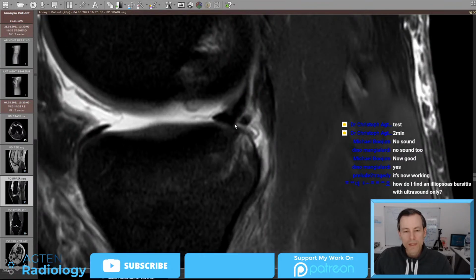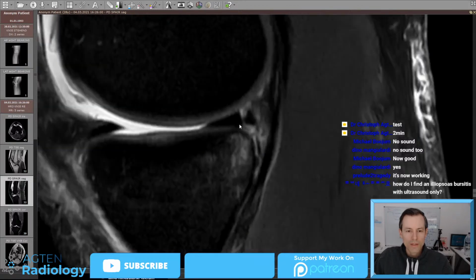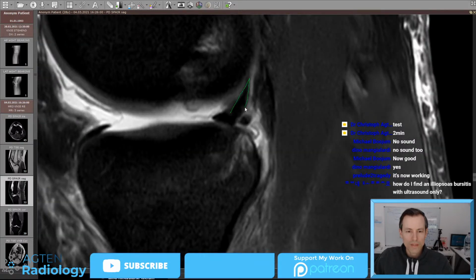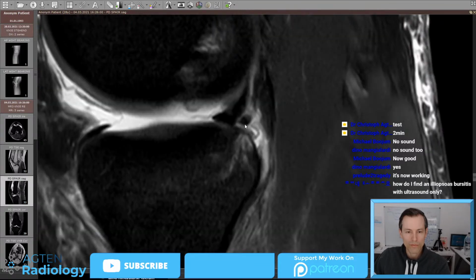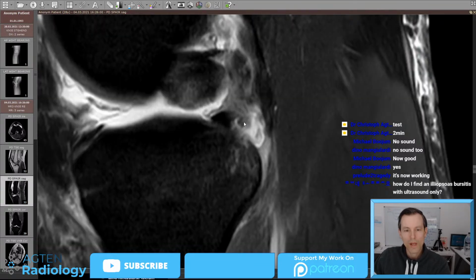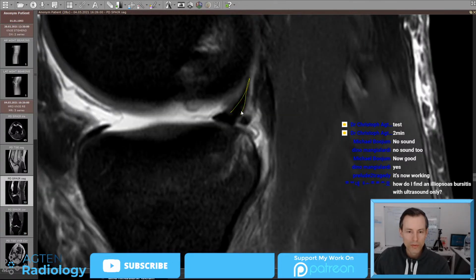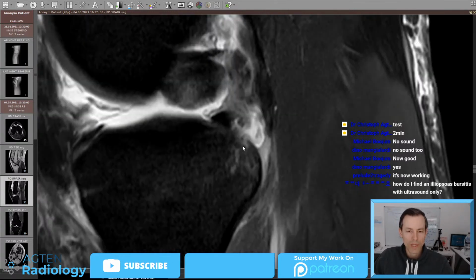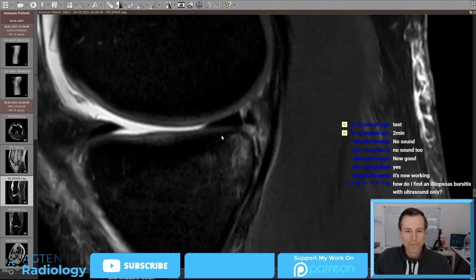Nevertheless, I think this qualifies as a ramp lesion. It's a complex tear basically, but we have certainly a ramp lesion, and in addition to that we have this kind of dislocated or displaced meniscal flap tear, and also one component here which kind of lost it here. So we have meniscus substance here, and there it's completely gone. So this one here could be tricky to see, and I think it's nevertheless important to realize so that the surgeon doesn't forget about it.